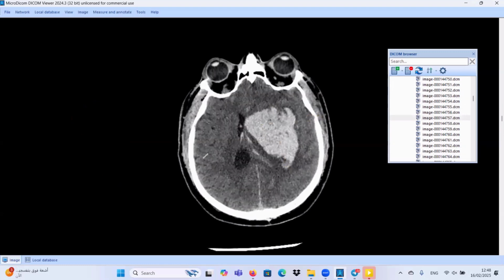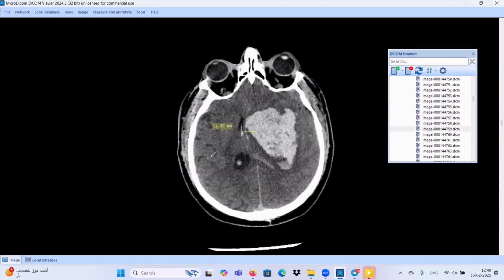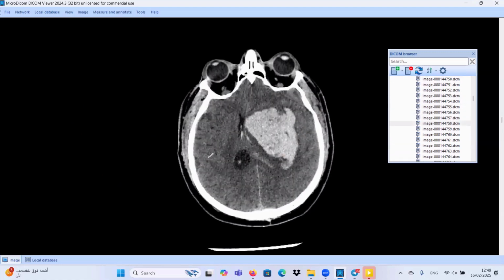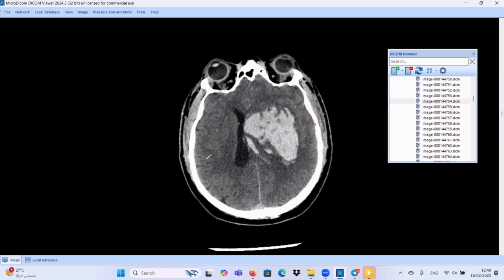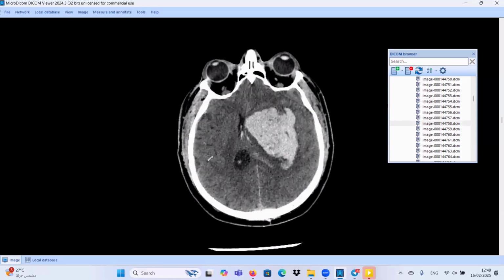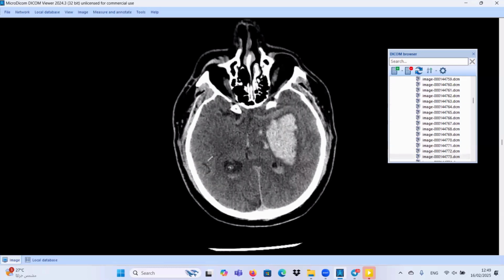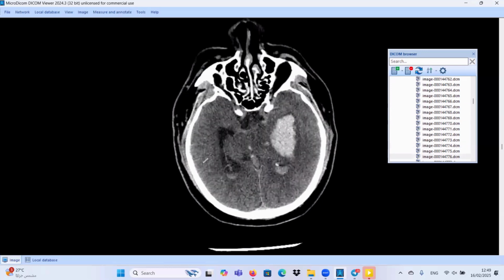We need also to add some of the most important findings, that we have also extension of the intracerebral hematoma into the ventricular system. This one inside the compressed ventricular system. So we have here intraventricular hemorrhage. Look for this one, the occipital horns, fluid levels with gravitated hemorrhagic blood content.